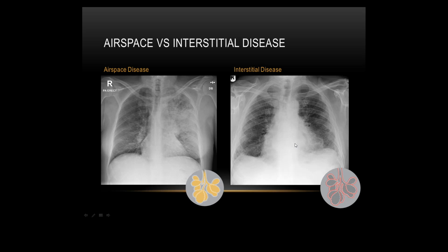So, cardiomegaly first off, effusions, and then upper lobe venous distension. As your heart starts to fail, instead of gravity pulling everything down, it pushes the blood up and diverts it upwards as well. So that's the triad of findings for cardiac failure: cardiomegaly, upper lobe venous distension, and bilateral pleural effusions typically. I have seen cases where you have a unilateral effusion.